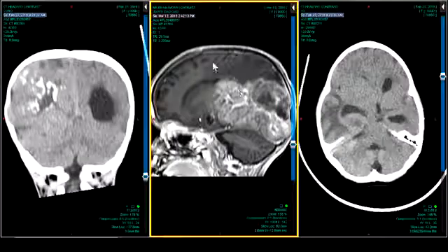Sometimes, the enhancement pattern, snowball kind of thing, they can be different, but they can both be periventricular, both cross the corpus callosum. So sometimes that diffusion can bail you out if you're having trouble making that distinction, and it's a really critical distinction because it affects the patient's treatment. It's going to be an older patient in this, but the diffusion can be useful there for the reason Dr. Pomerantz mentioned. Yeah, this one will diffusion restrict if we had one.